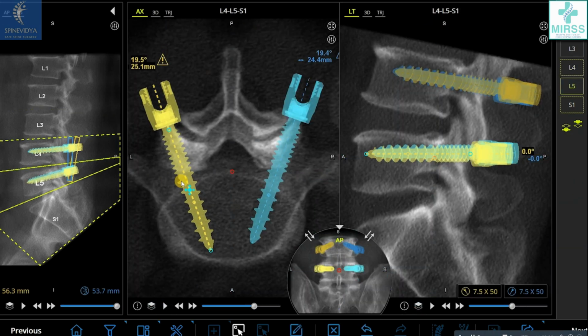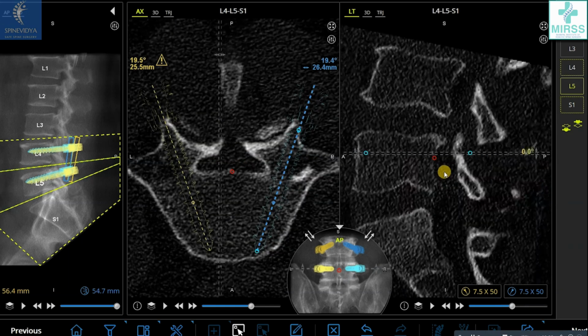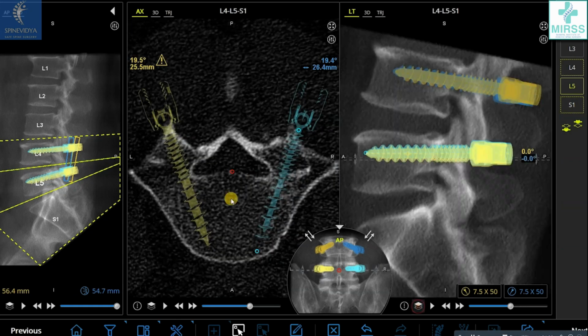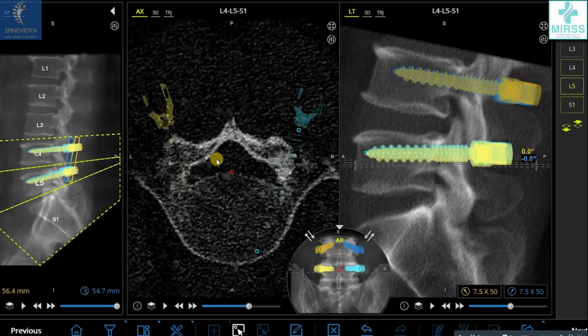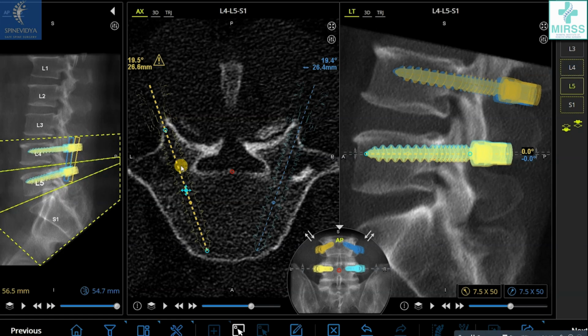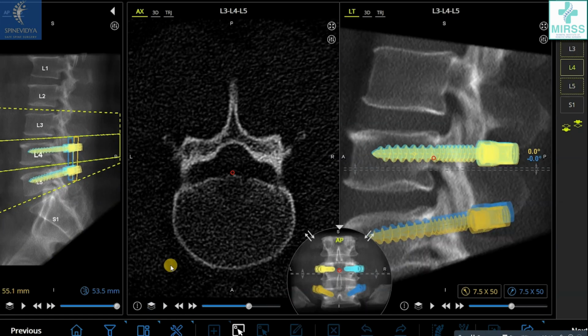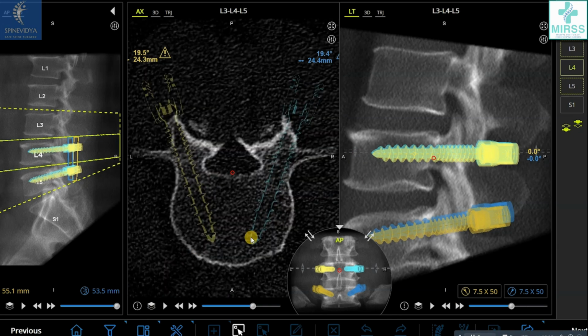During planning, axial and sagittal sections must be carefully analyzed to detect any pedicle wall violations. At L5, special attention is needed for the trefoil-shaped canal, which increases the risk of medial pedicle breach. Proper alignment of tulips in anteroposterior and lateral views is crucial to simplify rod placement.